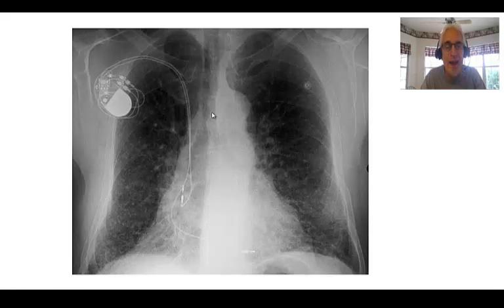Scarring does that. The bones look okay. Cardiac shadow is very fuzzy because of all the scarring around it. Diaphragms also have some fuzziness. There's no effusions, no free air, the good gastric bubble. The hilum, too, is kind of covered up by the interstitium.